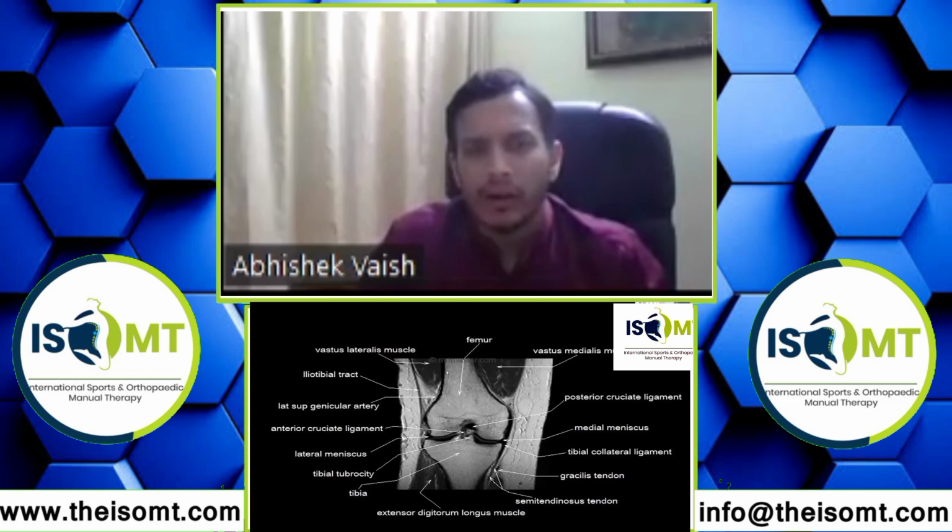So this is an example of a coronal cut. Based on your pilot image, where you are, you can see this is the femur bone on top, this is the tibia bone at the bottom, and there is a muscle on the lateral side. How do you know it is lateral? Because you can trace the fibula. And then there is the vastus medialis muscle on the medial side. Then you can see nice white cartilage here, and the medial meniscus, the lateral meniscus. Then you can see some tendons on the inside, the pes anserina bursa.